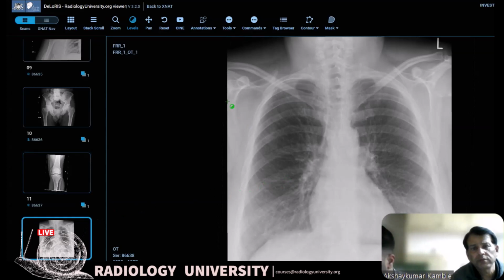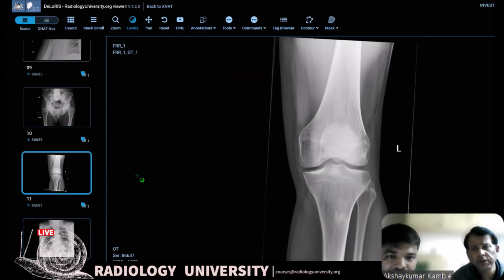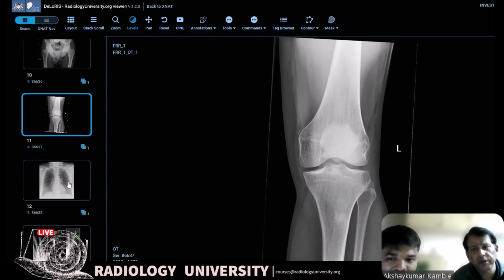Yeah. So the next one. Any question on the previous one? Anybody had any question on that? What to write for the diagnosis for this? Yeah, it's a Pellegrini's, or you can write a bony flake, medial condyle at the metadiaphyseal junction. Yeah. If you don't know the name, you can write left knee. Okay.